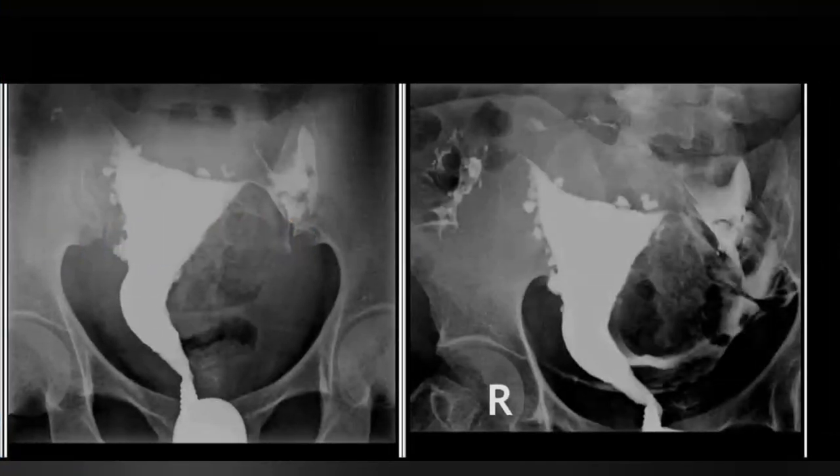Hysterosalpingogram examination. But if you find an enlarged uterus, like you see here, and irregular outline of the endometrial cavity and multiple outpouchings, as you see it here, then this is typical for adenomyosis. You see these are small outpouchings everywhere along the endometrial cavity. The diagnosis is adenomyosis.